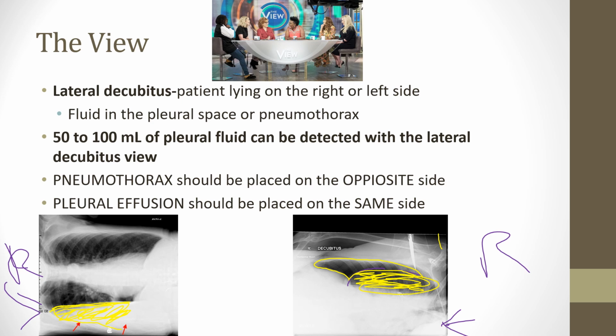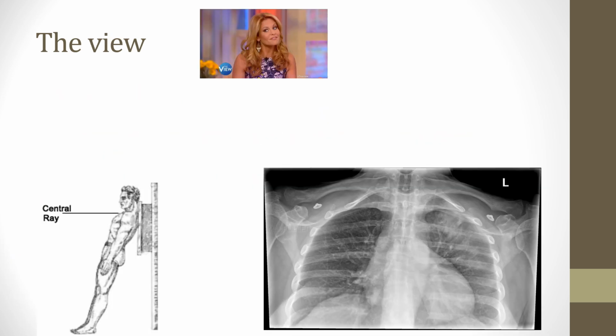So if it's fluid, place them on the same side. If it's air, place them on the opposite side. Alright, so apical lordotic. This one is a classic one they'll ask, especially if there's a coin lesion.